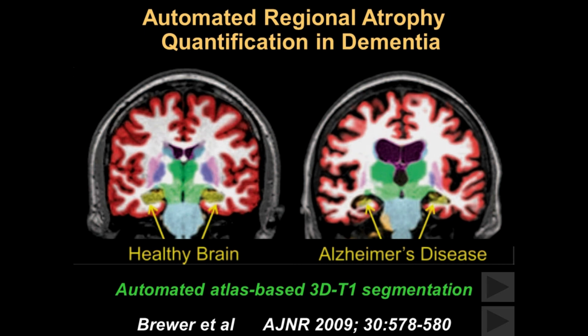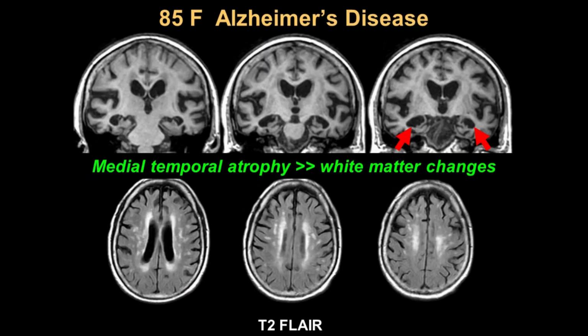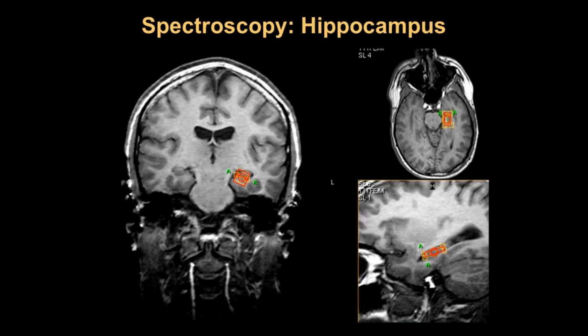We have to remember that this is actually an important differential for mesial temporal sclerosis, that Alzheimer's patients also get hippocampal atrophy. Typically, they don't have visible bright signal on the T2 FLAIR, even though they do have gliosis pathologically. But the key thing with Alzheimer's is we have marked ex vacuo dilatation of the temporal horn. And in fact, the ratio of the enlargement of the temporal horn to the smallness of the hippocampus is the most telling morphologic feature we'll see for Alzheimer's. So don't confuse this for mesial temporal sclerosis.